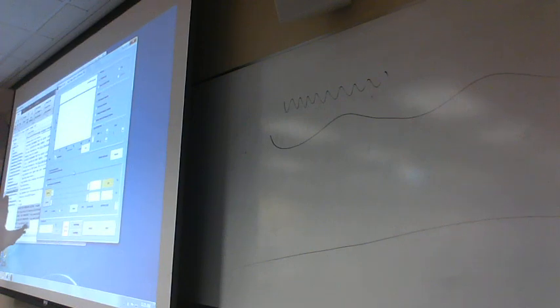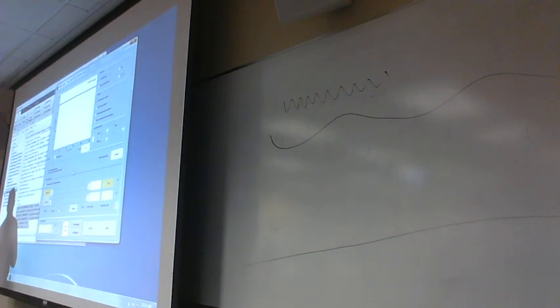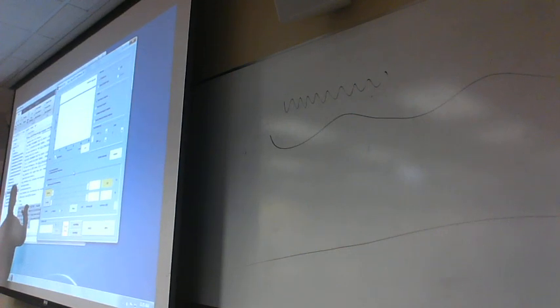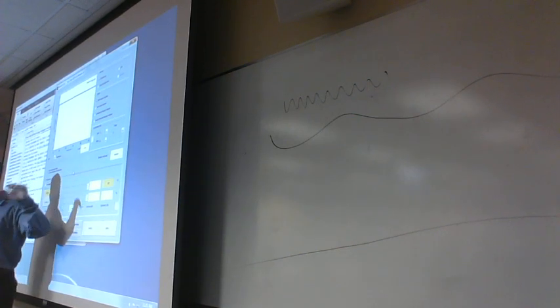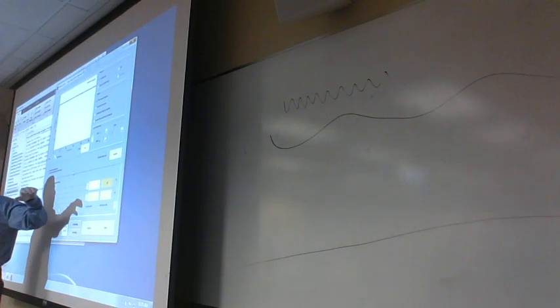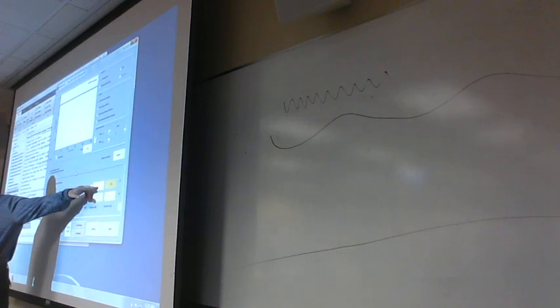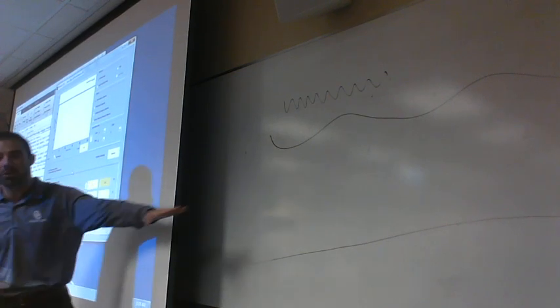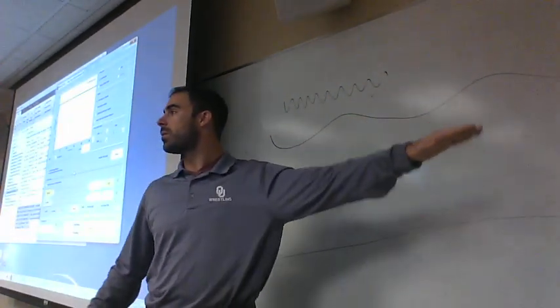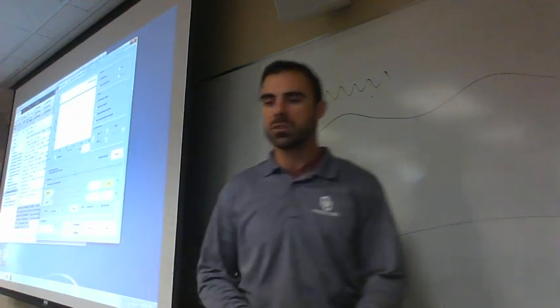So we just apply the high pass filter, and it filters out anything below our value, which sounds opposite of high pass. But our value is 0.1, which means it allows anything higher than this value to pass through and be kept. Anything beneath here, any of these low, slow drifts, is filtered out. So let's just do that and hit apply.